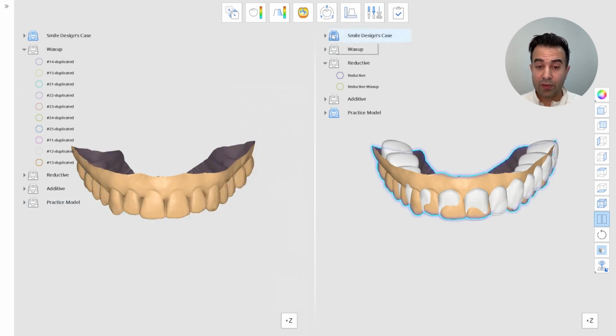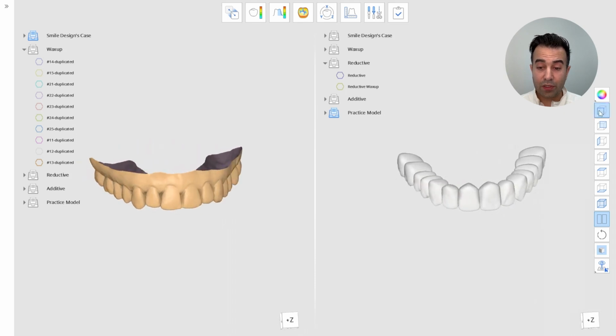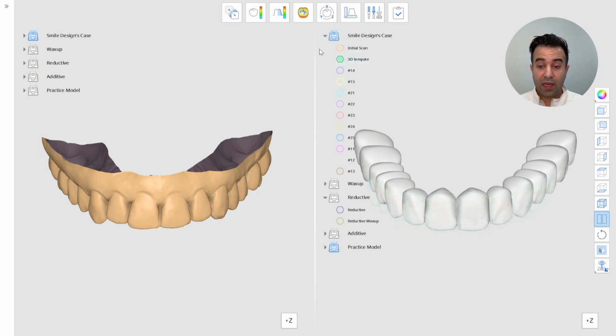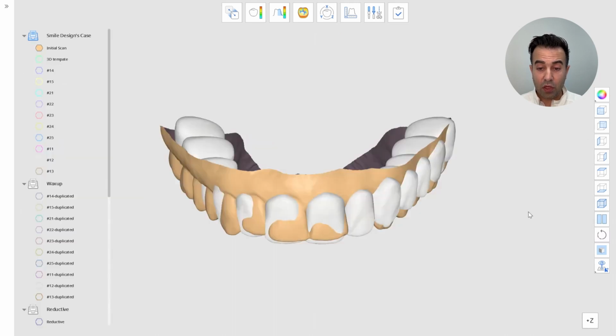And of course, we can use the other app, which is a Model Builder app, in order to allow you to print that 3D mesh. So Model Builder app is another app on the Medit Link that would allow you to convert a 3D mesh into a 3D printable object.